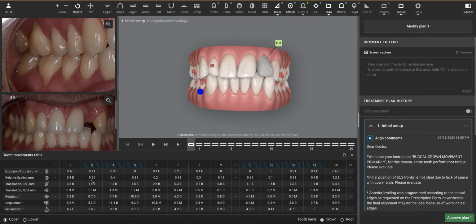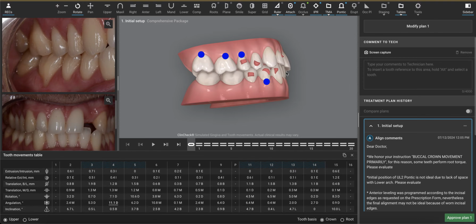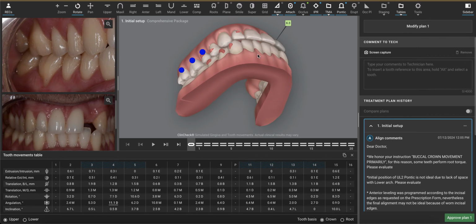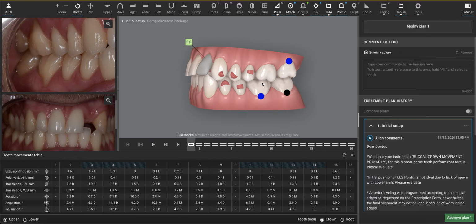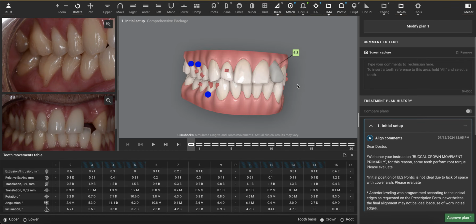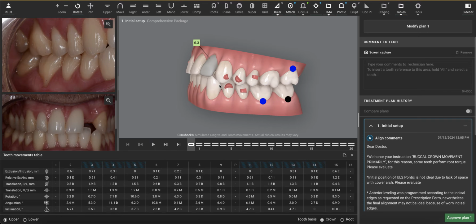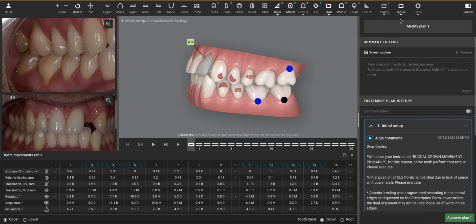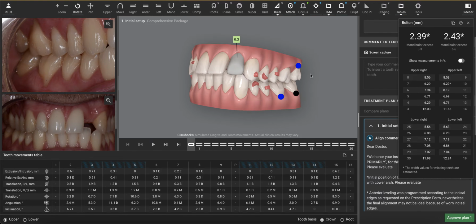But just taking a step back at the patient's situation, missing number 10, sagittal relationship, class 1, no missing premolars, overjet is sufficient, somewhat class 3 molar relationship here. If we have class 3 on one side and class 1 on the other, we should see a midline shift, which we do. Bolton analysis, let's take a look at that. Yeah, pretty good Bolton discrepancy here.